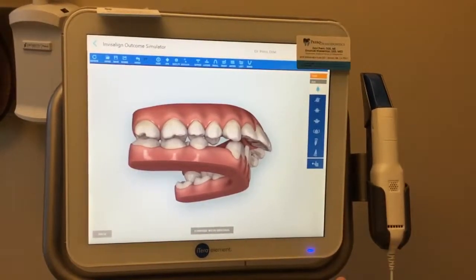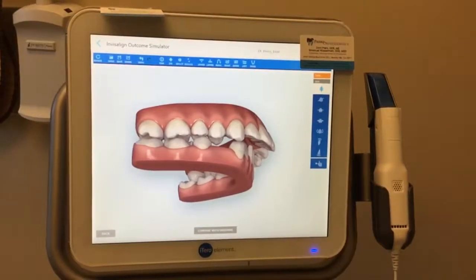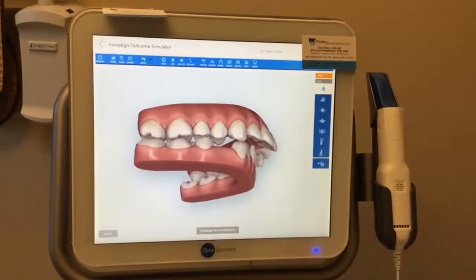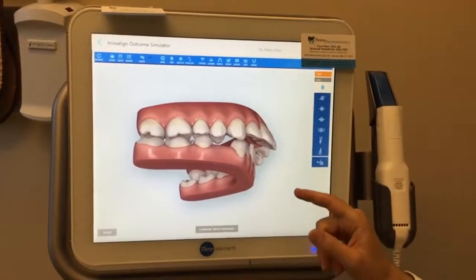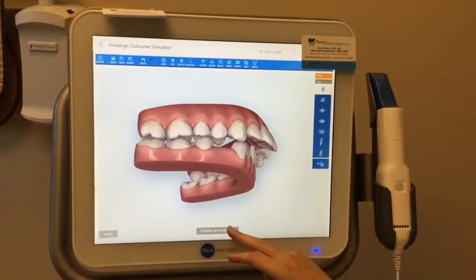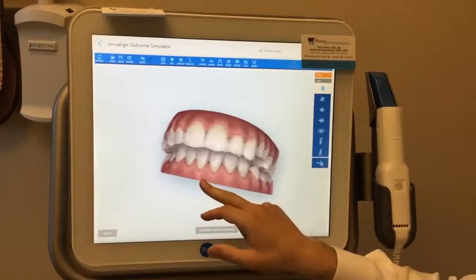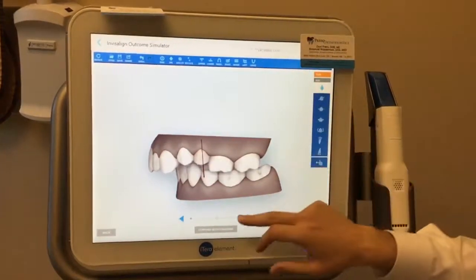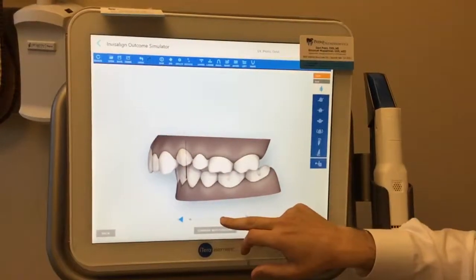Now I've explained the rationale to mom. Number one, we've taken out the lower bicuspids in order to correct the crowding, but we're left with more overjet. Now that overjet is going to help us because that will allow us, right mom, to now advance the mandible even more forward. Now how am I going to show the simulation of the mandible being more forward? I'm just going to extrude these just because my heart is telling me to.